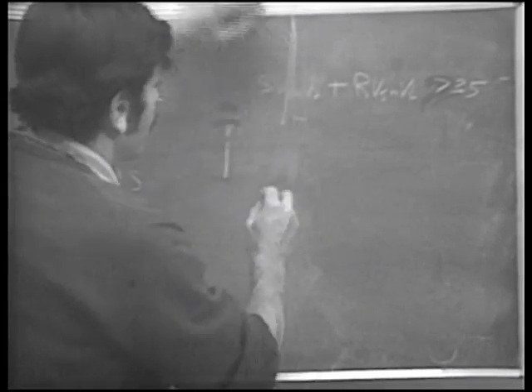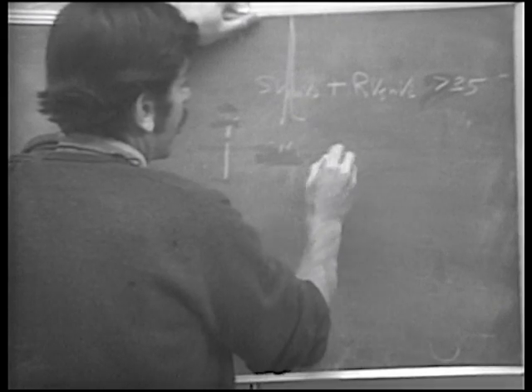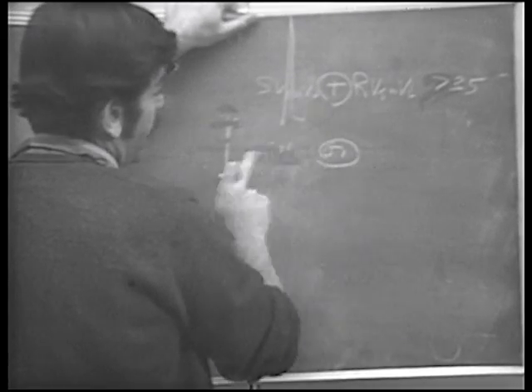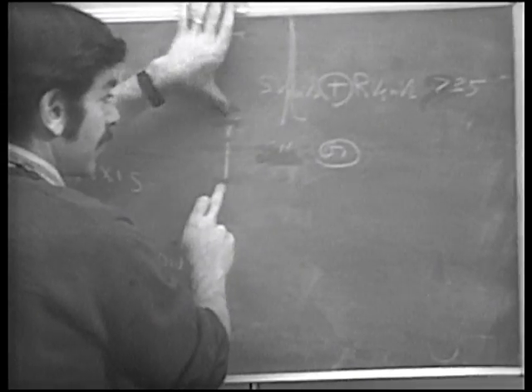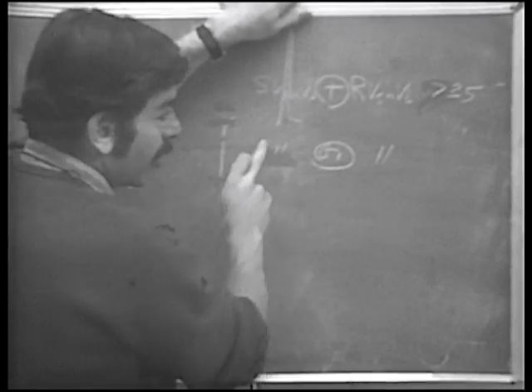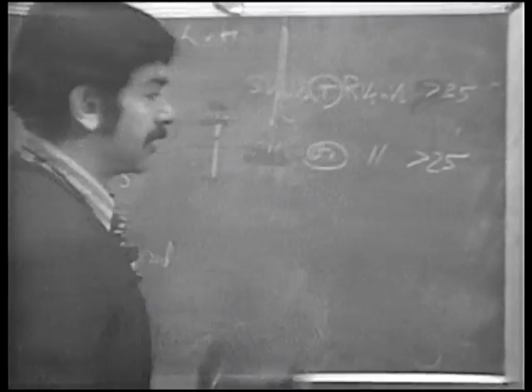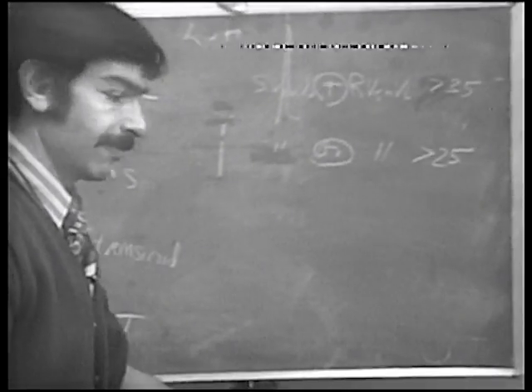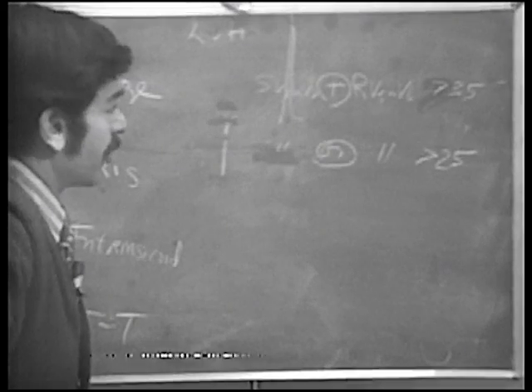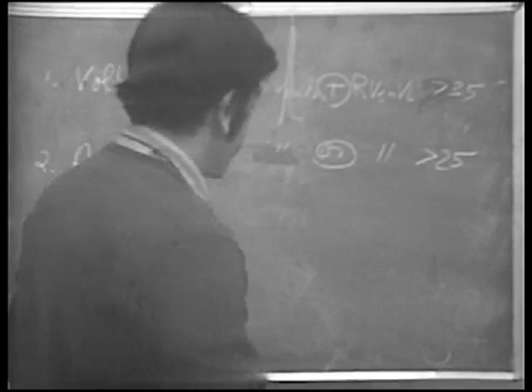All right, now you can also say you take the S in V1 or V2, or the R. This is "or," not plus. Now we take either one by itself, this deep S or this tall R, either one by itself greater than 25. Some people say 26, some people say 24. I think 25 is certainly adequate. It's a good number, and it's easier to remember. Okay, then there are a few other numbers that are nice to remember.